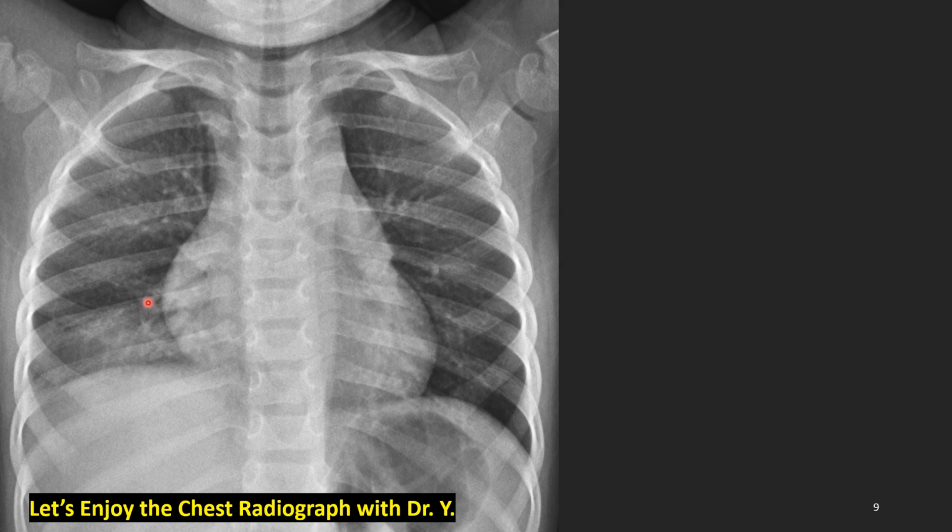What's the difference? Minor fissure is not remarkable, and right heart border is clearly visualized, and air bronchogram here at retrocardiac area with dense retrocardiac area. Correct. Right lower lobar consolidation of pneumonia.